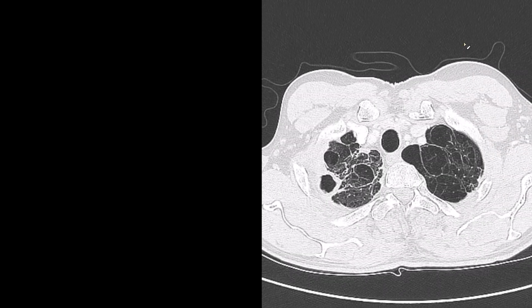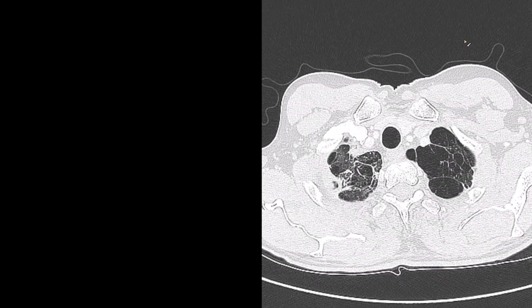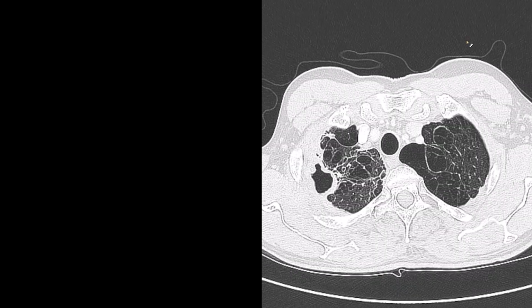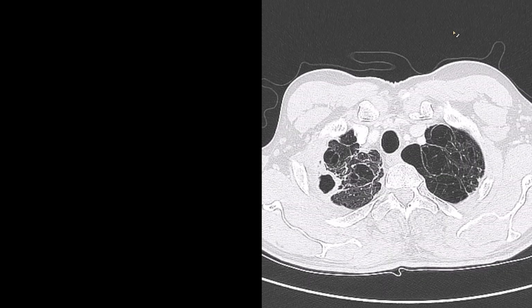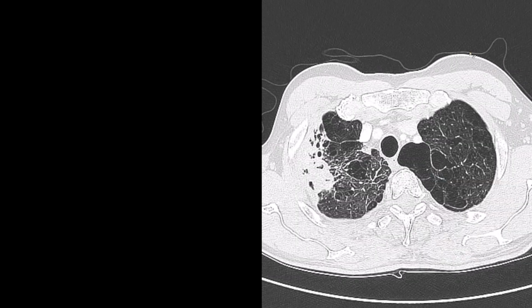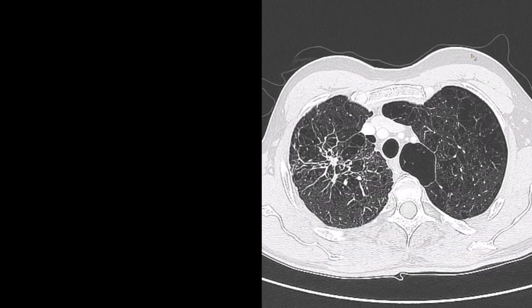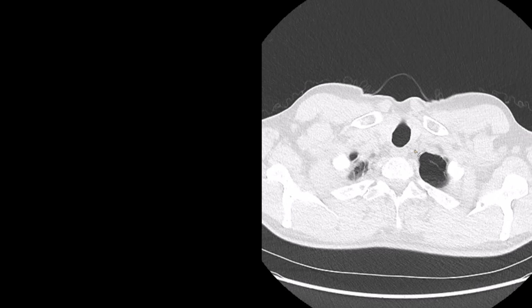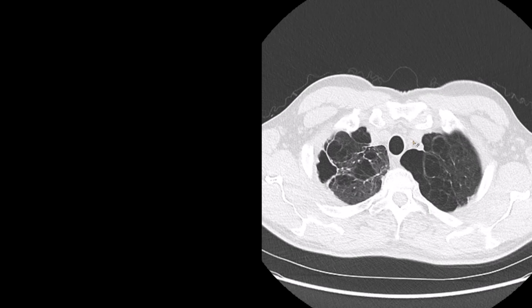And again, for this case, I'm not really sure if this is a lung cancer or an infection. And even if I were to favor infection, lung cancer is not far down on the list. So that would have to be excluded in this patient, particularly given their risk factors. This turned out to be Mycobacterium kansasii, and as I mentioned before, that particular species can look exactly like Mycobacterium tuberculosis. This patient was treated with antibiotics, and the antibiotic regimen in these patients is not simple.